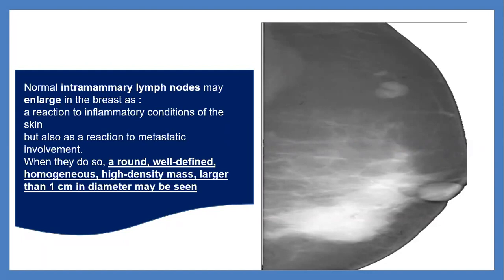In case of loss of its fatty hilum, if it is rounded more than oval, increasing in size in different scans.